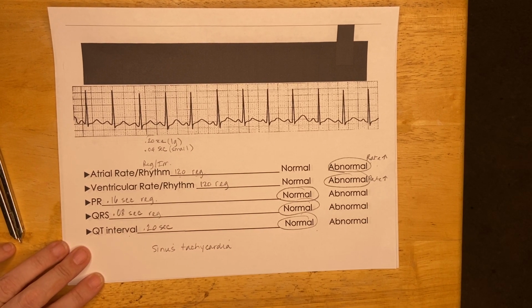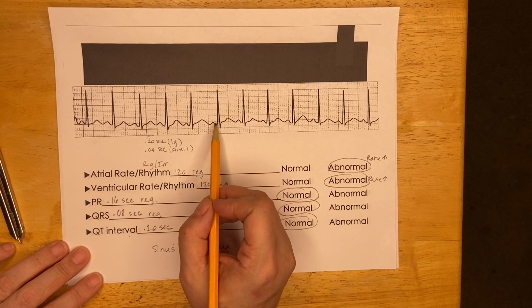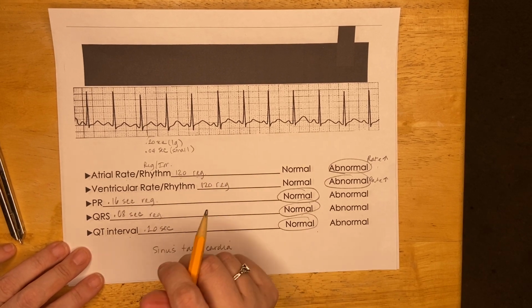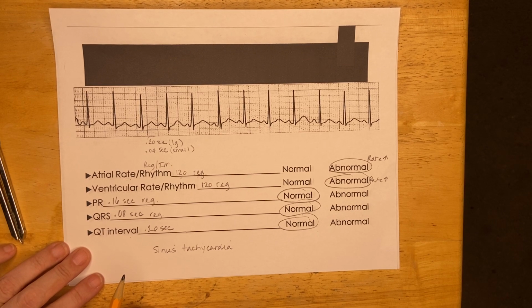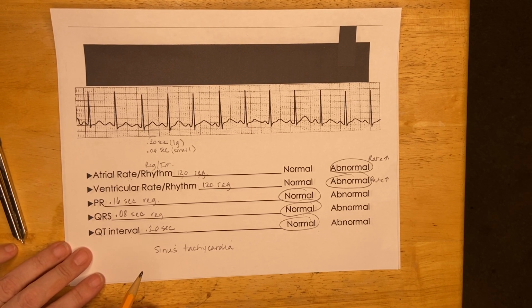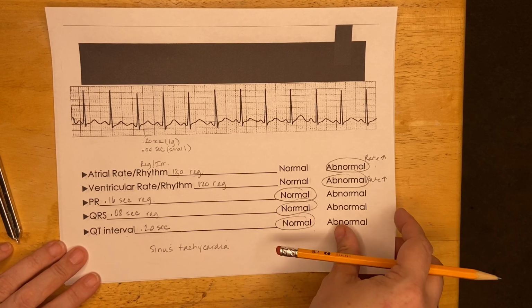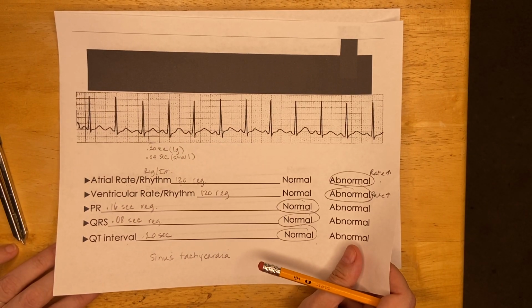There are other kinds of atrial tachycardias, and we're going to talk about those, but you're not going to see those uniform and regular normal-looking P waves in those, because in those, the SA node is not in charge anymore. And when the SA node abdicates its position as the leader of the electrical impulse, then crazy things start to happen. You start to get atrial anarchy. We're going to talk about that. I know I keep saying that, but we really are. So one more practice and this video is going to be done.